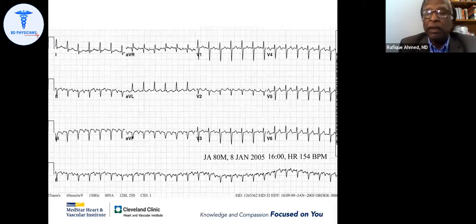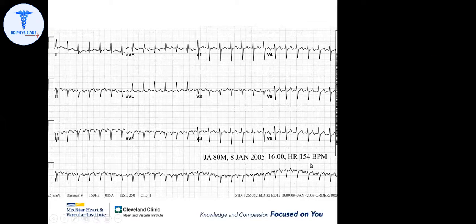Thank you, sir. Anybody else want to do this one? This is again a heart rate of 154 beats per minute.